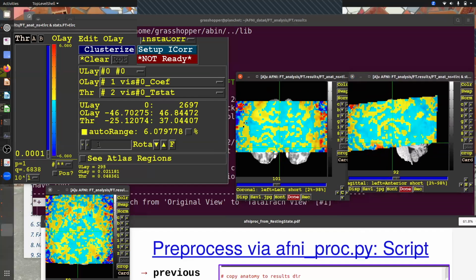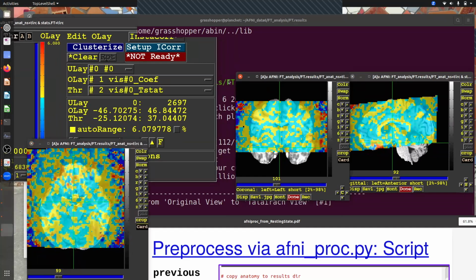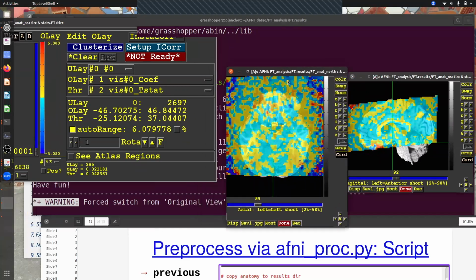All right, so this actually is the results of all our processing and what we're trying to look at when we have fMRI data. If you remember, we used to have time series everywhere in the brain. And then we said, what do we want to do? We want to see, well, which of those parts of the brain are involved with different tasks. And at the end of the day, we get out a statistic map and an effect estimate map of where that is for everywhere in the brain.